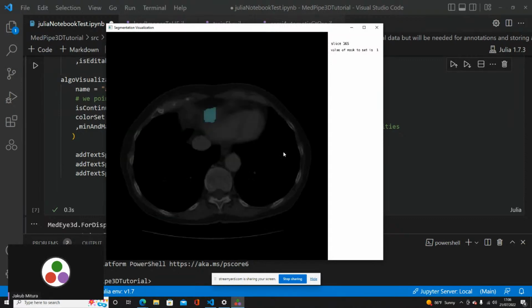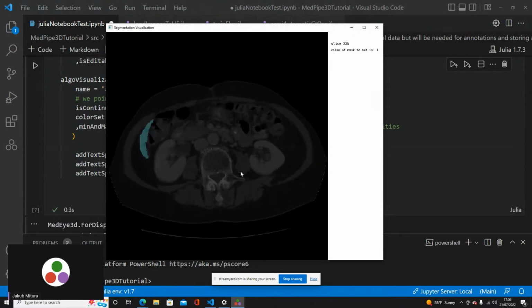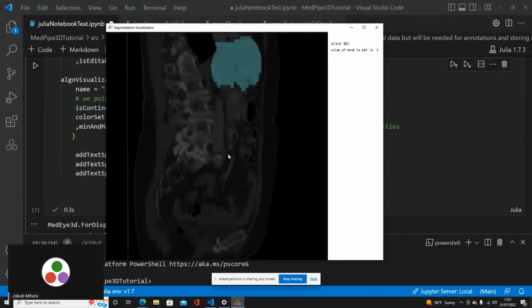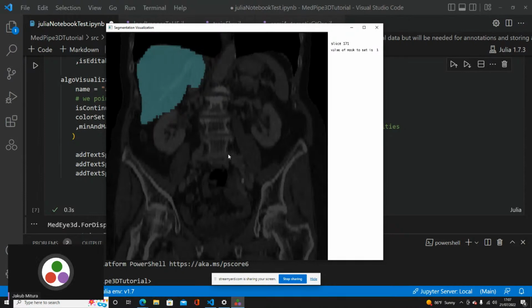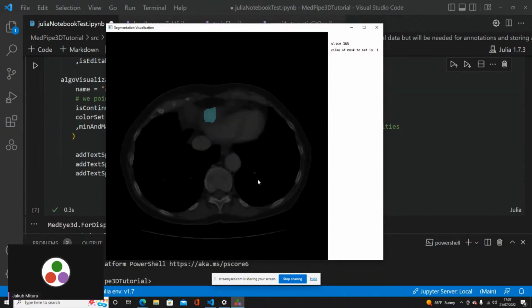As I told you, in the case of the CT scan, those that we see now, the transverse scans, the slices through the organism, have the highest resolution, basically, because they are the original ones. But we can also see the patient from the side and from the front. This is done by pressing space: space 1 would be sagittal, so from the side; space 2 would be from the front; space 3 would be transverse.